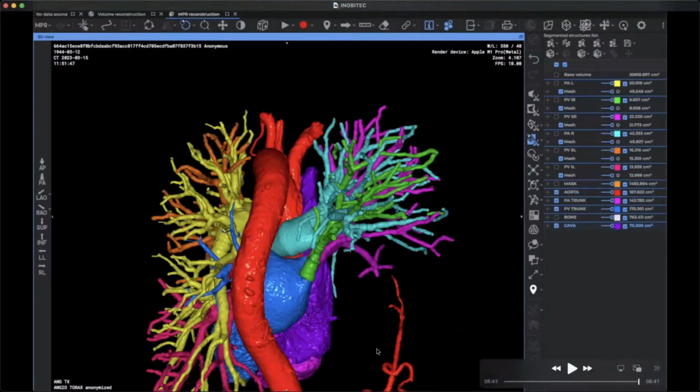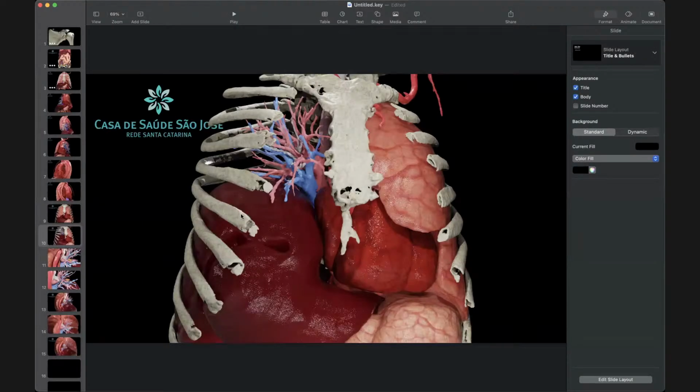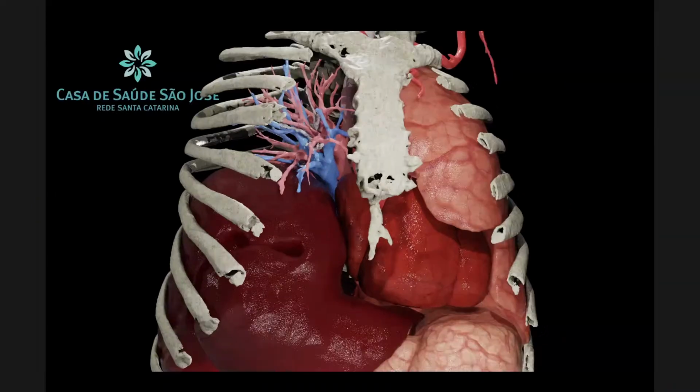That looks amazing. Thank you for this demonstration. Do you have your post-processing stuff for that? Yes, yes. Can you please show us? How does it look? It's right here.